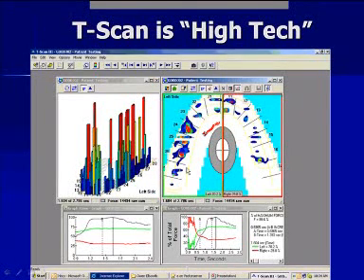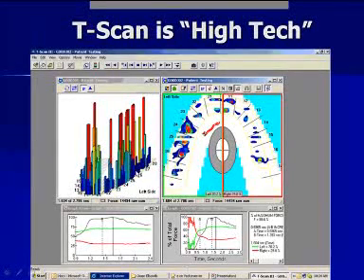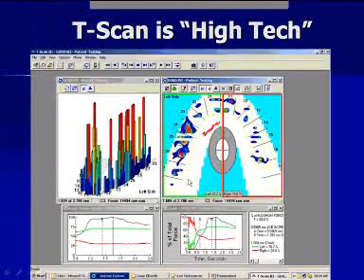I'll show you in real time in a few minutes how this works, but it doesn't take a rocket scientist to see that there's a lot of red here, and there's tall spikes, that there's obviously a lot more force going on the patient's left side than there is on the patient's right side. And left untreated, this will break down. He's only 15. We want to be able to balance things early on. So this information is what got the patient to commit to treatment.